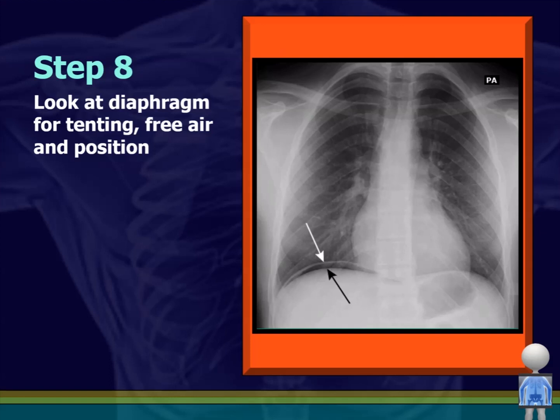So you're looking at this chest film because the patient came in with nondescript, let's say epigastric pain, or maybe they even described it as pleuritic chest pain. Who knows? Patients present different ways, and you find that they have free air. I may have a perforated viscus. I have an intra-abdominal pathology. So this is how on your chest film you should be aware that you might see something that is not intrathoracic. So looking for free air under our diaphragm is a way we can find an abdominal pathology on a chest film.